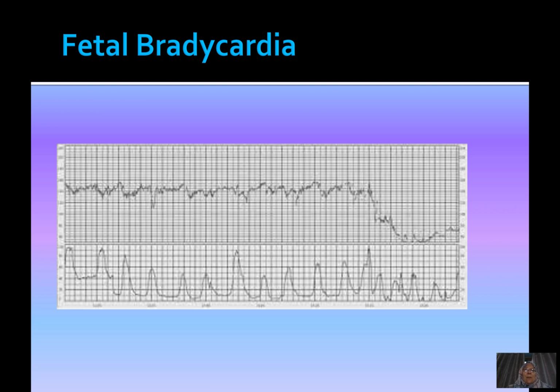So if I tell you now, and then you can compare your notes to mine, you can see that this patient has contractions, and it seems to have 5 to 6 contractions every 10 minutes. So this is quite frequent contractions.